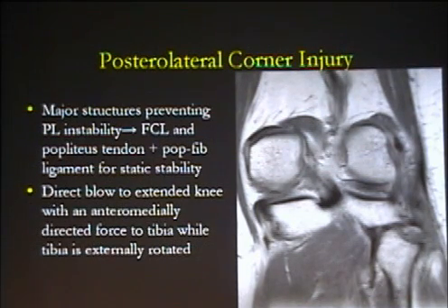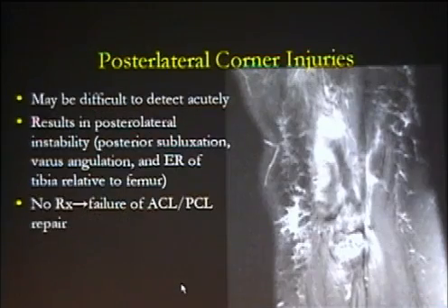When all that happens, this is what you get, okay? This is injury to the posterolateral corner. In this case, note where the avulsion fragment is. This is from the lateral aspect of the fibular head. This is from the insertion of the fibular collateral ligament and the biceps femoris tendon. Okay, this is what injury to those structures looks like. This is not injury to those smaller structures of the fabellofibular and arcuate ligaments. Okay, typical appearance: fibular collateral and biceps femoris injury.